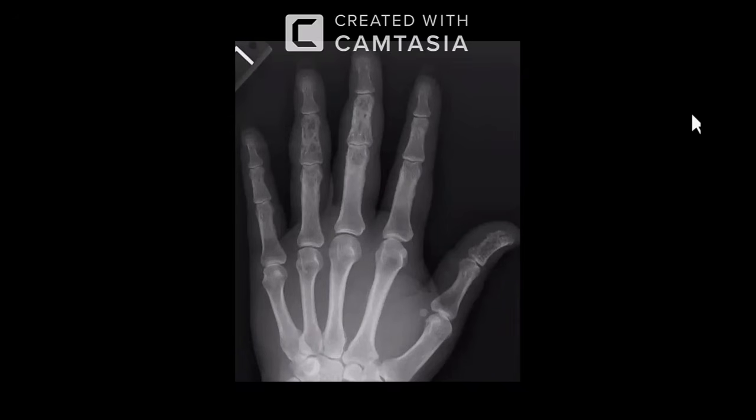I'm thinking of sarcoid, giving the lucency with sclerosis. Another differential could also be osteomyelitis, but I cannot appreciate any cortical erosions. So I would notify the referrer with this finding.